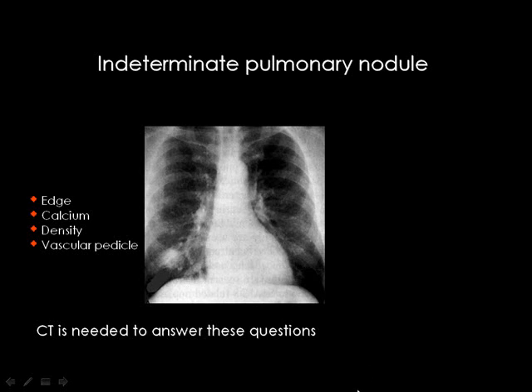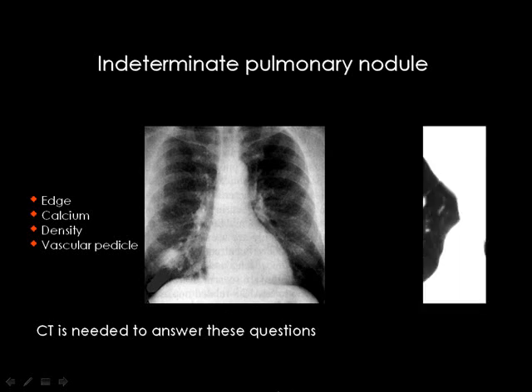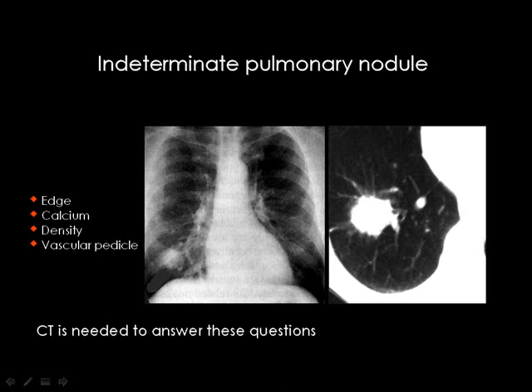If you fail, and you will fail, of course, because the chest X-ray will not lead you to suspect that this is fluid. You should have a CT or ultrasound to confirm the possibility of fluid. Then if you do a CT scan, then you can see that this nodule has a spiculated margin and it is a neoplasm, not a benign nodule.